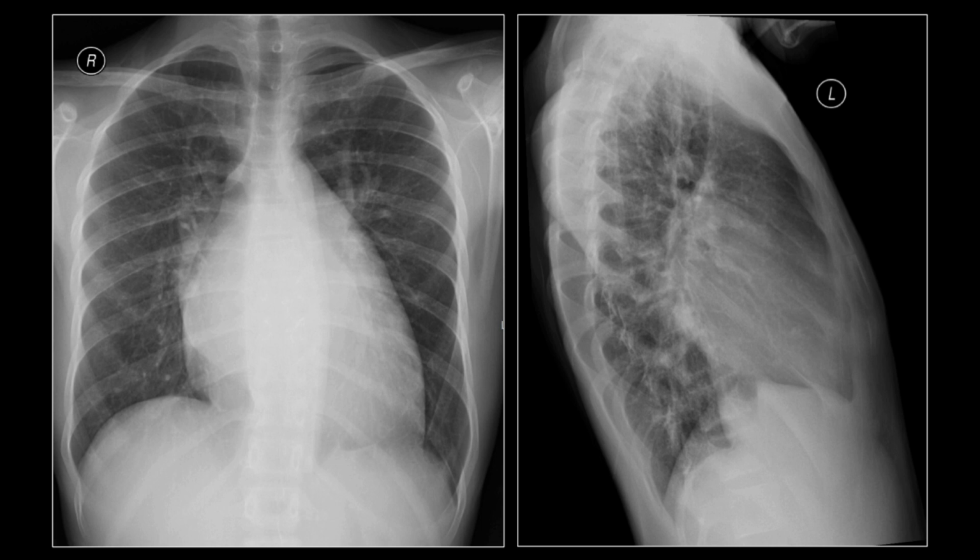Once you finish that, don't forget to mention a good recommendation that fits with the case. The recommendation you mention in an oral examination should make sense. It should be something that you would recommend in daily practice. So here, the next logical step would be to recommend an echocardiogram. And then depending on what the echo shows, you'll take it from there.